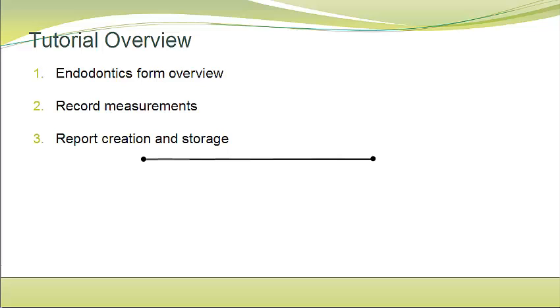In this tutorial, we will review the Endodontics form. We'll show how to record measurements for a specific tooth and see how we can generate an endodontics report and how to store it for future use.